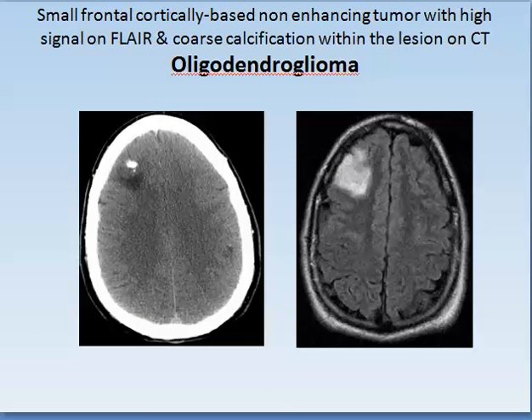Another mass with calcification with minimal edema, oligodendroglioma. It's non-enhancing. So the three fulfillments: a mass with mass effect, showing calcification, and usually not enhancing.